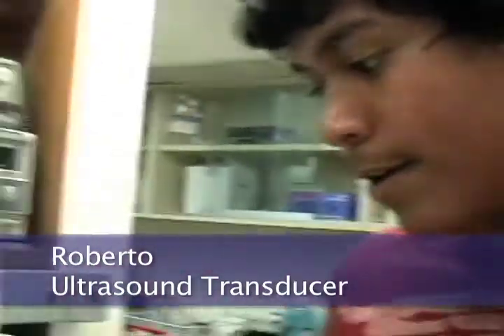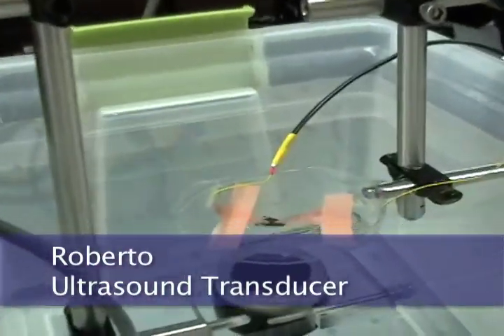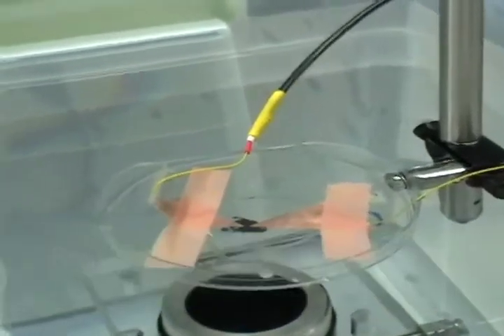Research lab, where one of the most important tools we use is called the Ultrasound Transducer, which is right here. This transducer is used to image objects such as organs, tissues, and even blood flow inside of the human body.